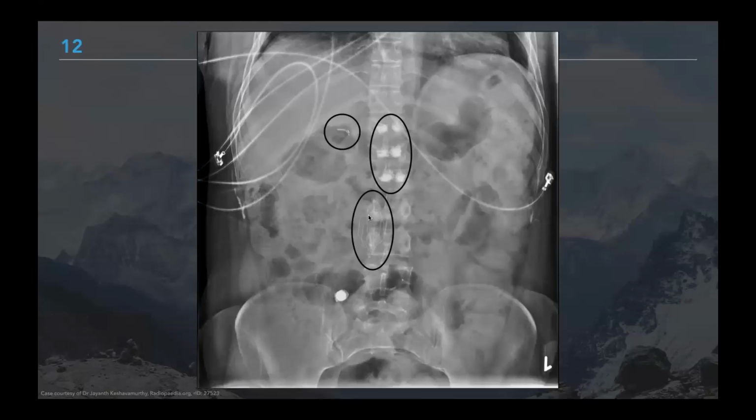There's also this cage-like thing. So you'll remember that the IVC is to the right and the aorta is to the left. So this is something called an IVC filter. So in somebody who has DVTs, you would normally anticoagulate them, but let's say, for example, they're a trauma patient and they've also had a subarachnoid or something, and you can't anticoagulate them because of the risk of further bleeding. Then you would ask your kind interventional radiologist to put in something called an IVC filter, which is designed to basically catch the clots coming up from the legs before they become pulmonary emboli.